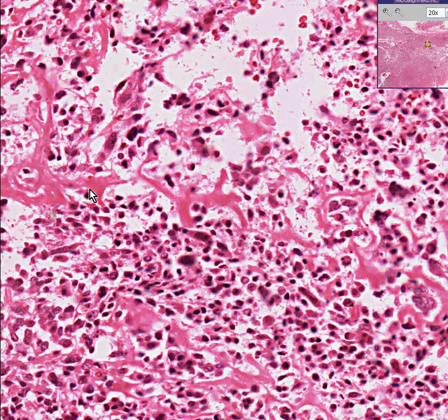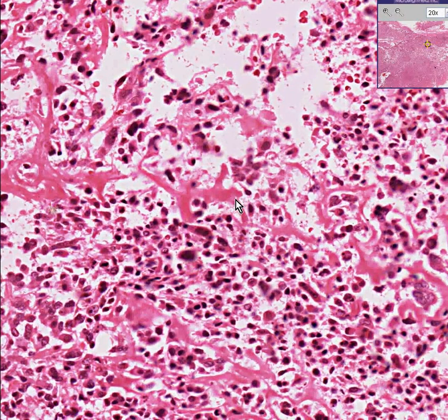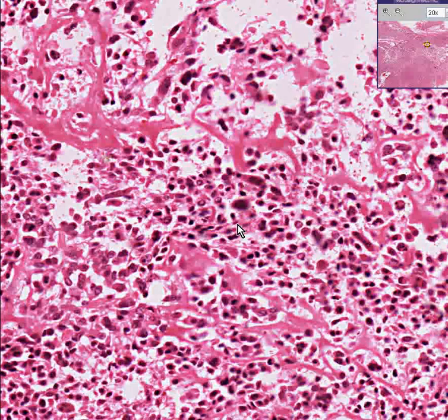Notice that there is not much by way of osteocyte dwelling within these spicules yet, but it has an irregular, proteinaceous, perhaps not terribly calcified matrix, so classical of osteoid.